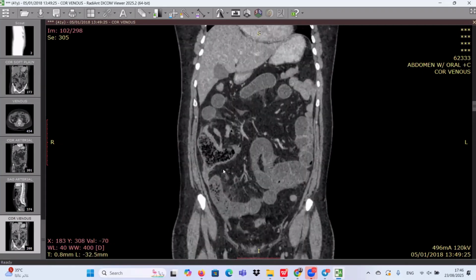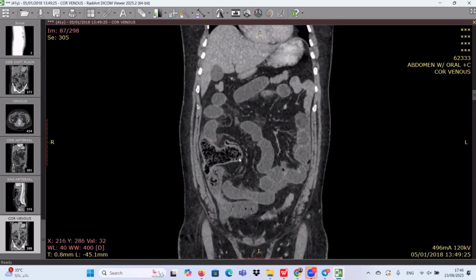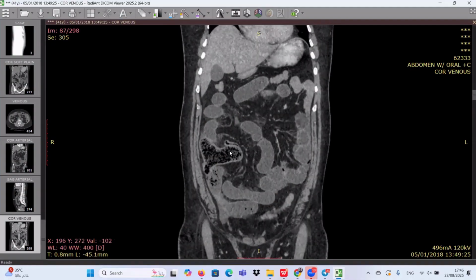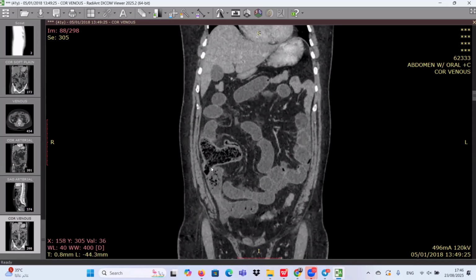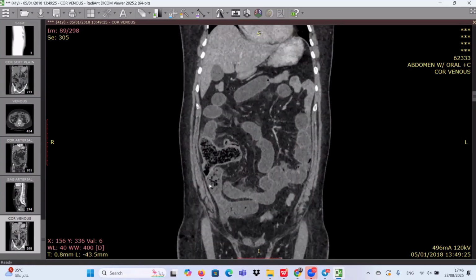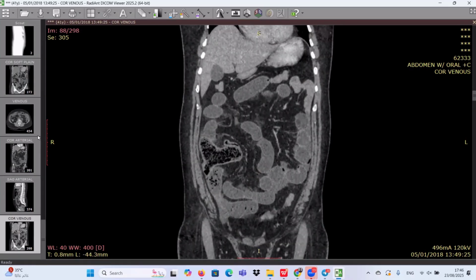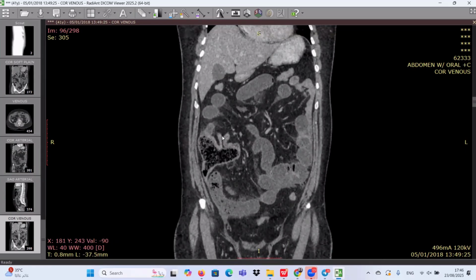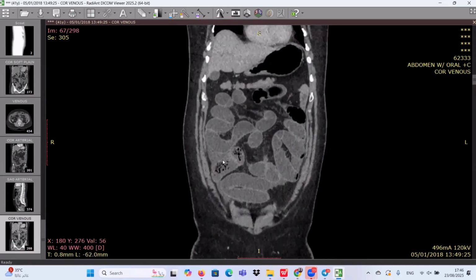This is the exact transition point, and the feces sign here, the retained feces or the retained enteric contents, can form something like feces inside the small bowel. This is the small bowel feces sign. By the way, it is helpful to identify the site of the transition. Once you have the sign, you are very close to the transitional point. Also, if we have a long segment of small bowel feces sign, and also we have minimal ascites, minimal fluid collection.